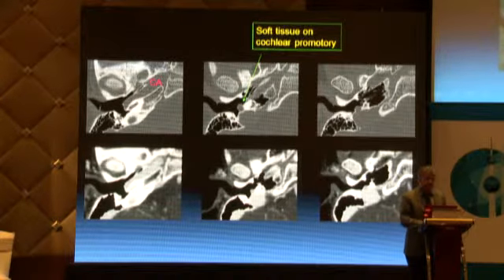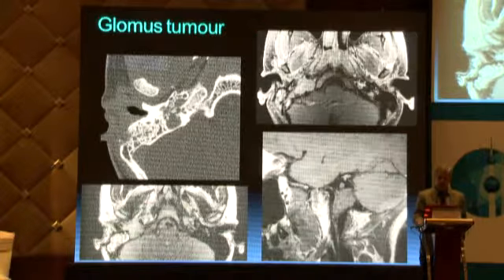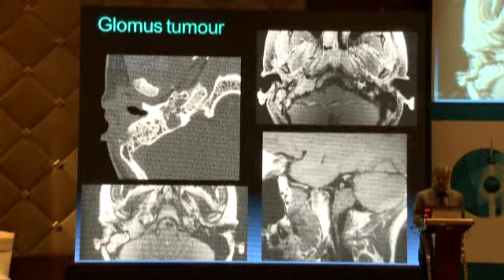So sometimes in middle life or older life, you have the jugulotympanic plate which can be eroded over time, a large jugular bulb which can prolapse into the middle ear, can also look like a retrotympanic vascular mass. And this is what a glomus could look like. You can see that it is an intensely enhancing tumor, has a very different appearance compared to the aberrant ICA that we saw.